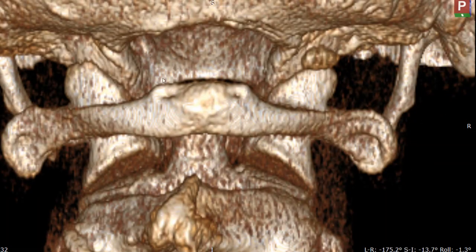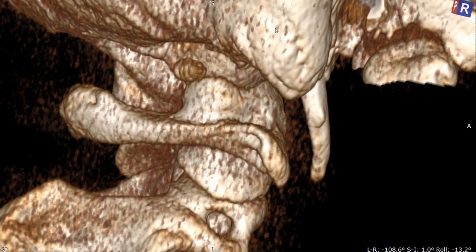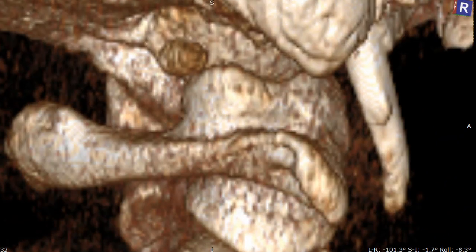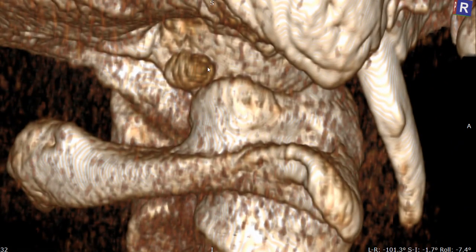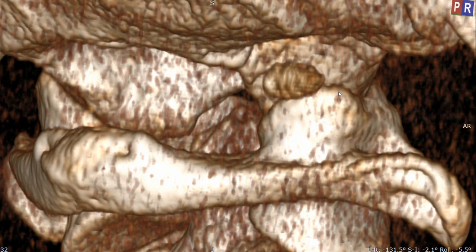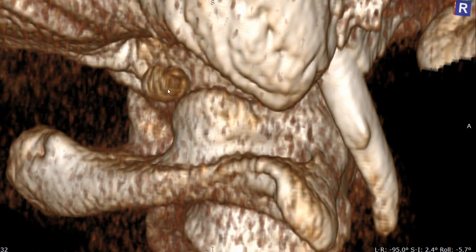And here is that peculiar spot here. Let me pause for a second. Okay, so someone might call this a condyle fragment, but this could be damage to the capsule ligament that comes around all the facet joints. Every facet joint has a capsule. It'd be a capsule here, capsule here. Now this could have been massive damage to that ligament, and when ligaments start to calcify, it starts to build right on top of that.